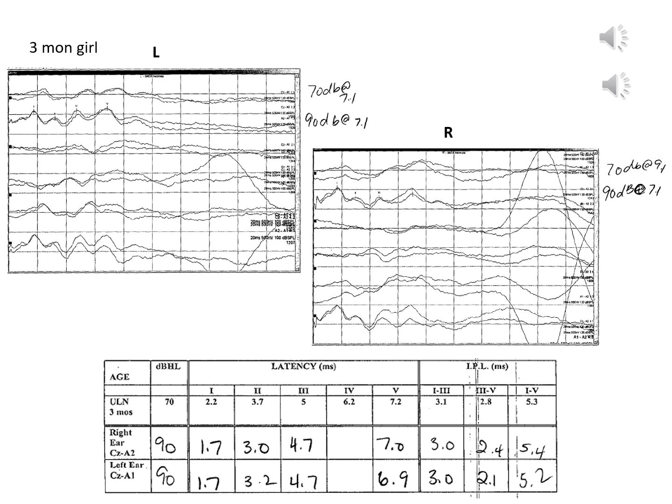And so moving down to our upper limits of normal, we'll notice that the tech has written down the absolute values for 1, 2, 3, and 5 at 90 decibels. And I just want to remind you that these numbers are not relevant to us now because the upper limits of normal for the absolute values are measured at 70 dB.